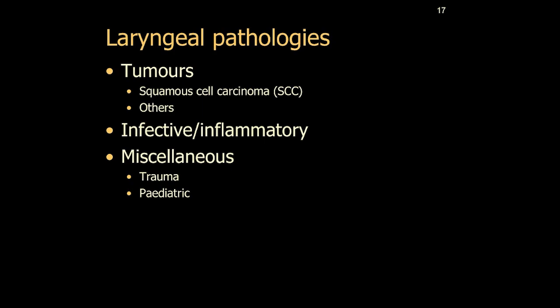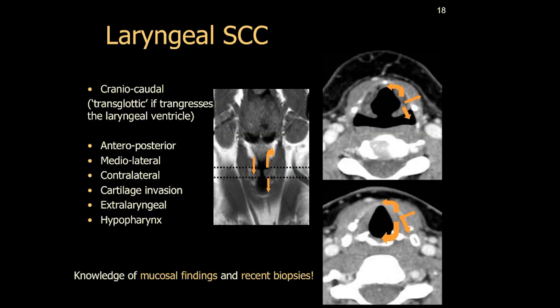A wide range of pathologies can affect the larynx, including neoplastic processes, infection, inflammation, and so on. However, the bulk of imaging is done for laryngeal tumors, especially squamous cell cancer, and therefore we will focus mainly on this area.